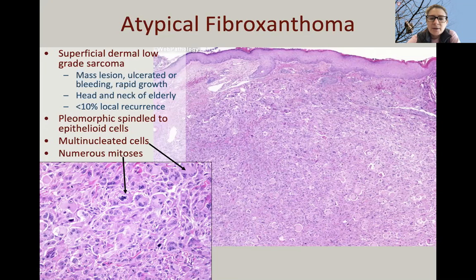And so I would just caution everyone with these dermal malignant spindle cell lesions. I would not diagnose an atypical fibroxanthoma on just a shave biopsy because we don't know what the deep base of it is doing. And we don't know if that depth is invasive into the subcutis or not. If it is, it's a totally different story. All right. So that's my word on AFX versus deeper dermal sarcomas. But both are dermal sarcomas. It's just restricted versus deeper. And behavior, as I said, is very different.